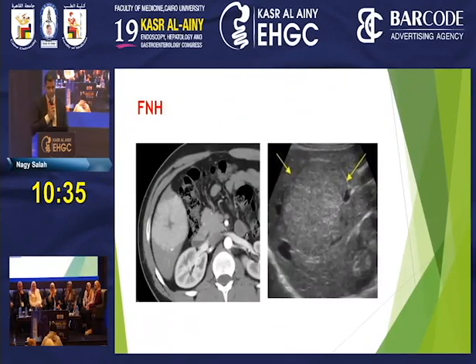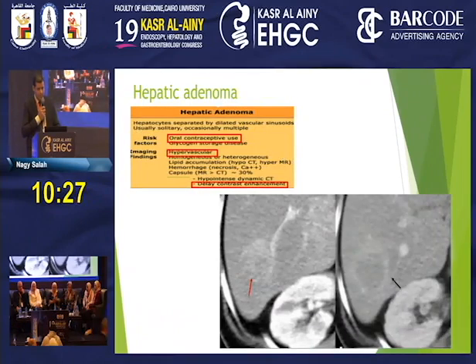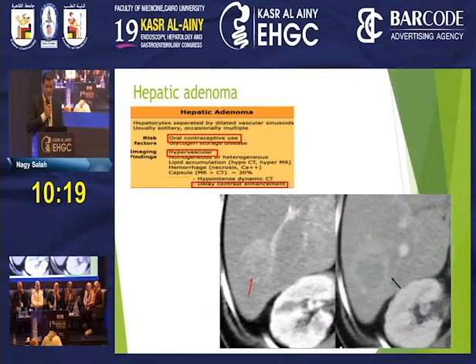Focal nodular hyperplasia showing homogeneous avid post-contrast enhancement with central hypodense scarring that shows enhancement at the delayed phase. Hepatic adenoma: hepatocytes separated by dilated vascular sinusoids, mostly in females of reproductive age with high risk for oral contraceptive use. Hypervascular lesion with delayed contrast enhancement of the capsule.